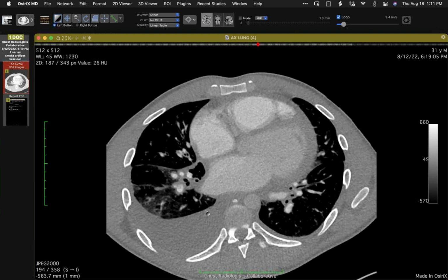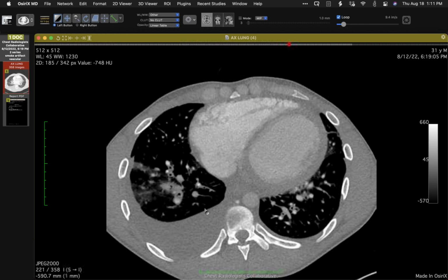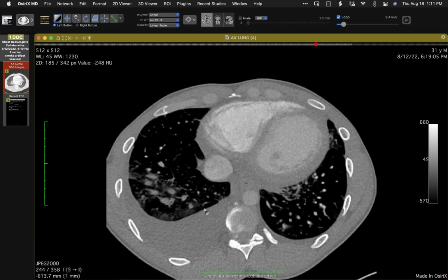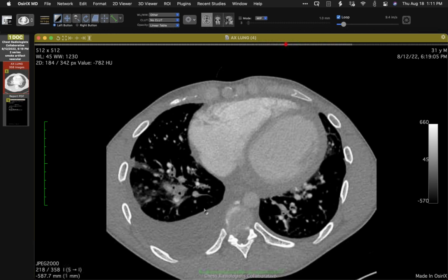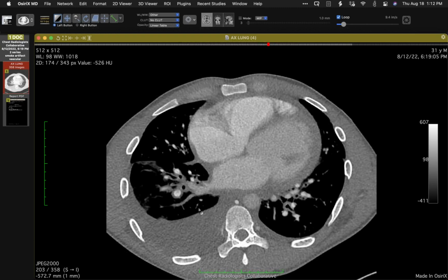I know we've seen a couple of other cases of bronchial artery inflow. So we have a shunt, but I don't think it's of a magnitude overall that it needs to be proven or taken care of as such. And I suspect, and I think I've read it somewhere, that these communications exist normally and different changes in the lung can sort of accentuate them.